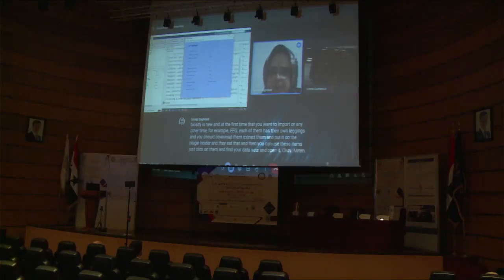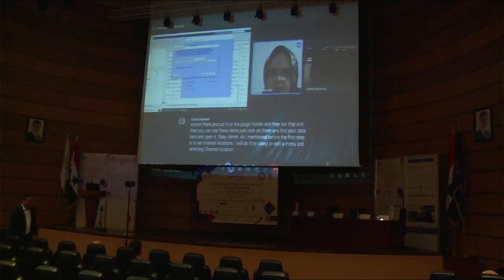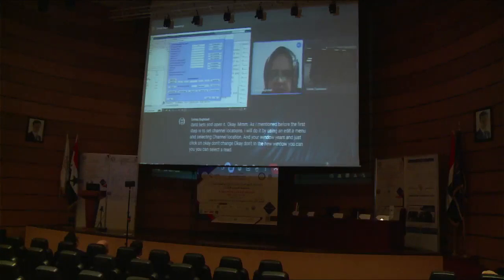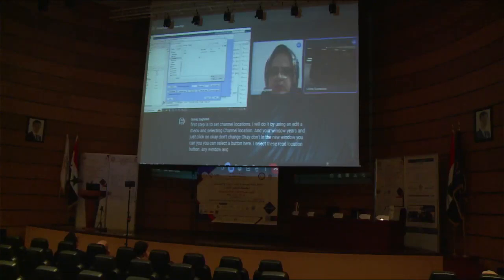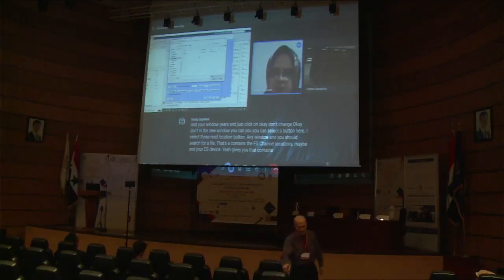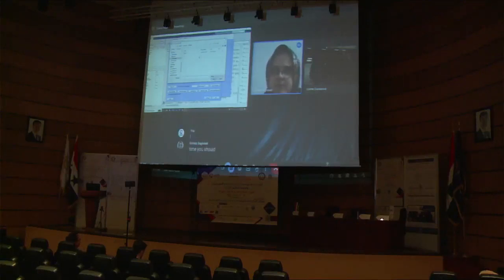Okay. As I mentioned before, the first step is to set the channel locations. I will do it by using the Edit menu and then selecting Channel location. A new window appears. Just click on OK. Don't change the defaults. In the new window, you can select a read button here. I select this read location button. A new window appears. You should search for a file that contains the EEG channel locations. Maybe your EEG device gives you a separate file that contains your EEG channel locations. But most of the time, you should create these files by yourself.